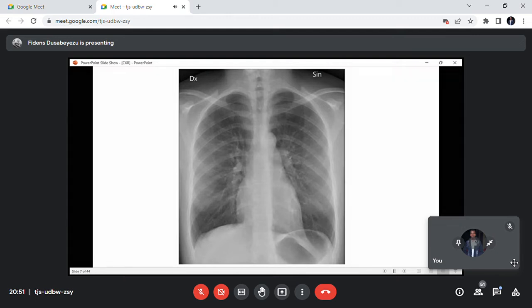A patient to do a deep inspiration. Now, you will miss that pneumothorax because the lungs that are filled with air look the same as the air in the pleural space. To look the same, it is a mild, small pneumothorax.